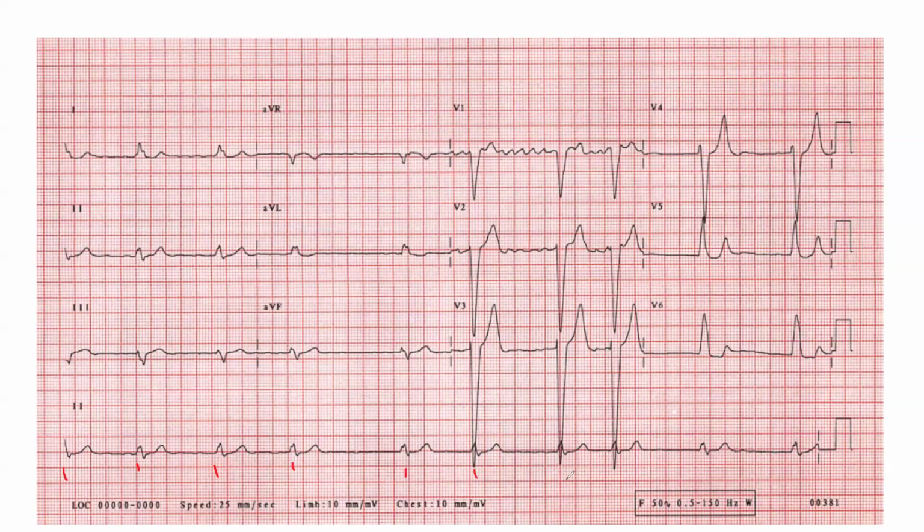It looks to be rhythmic. This is arrhythmic. You can see it right here that the RR interval is not the same. So it's arrhythmic.